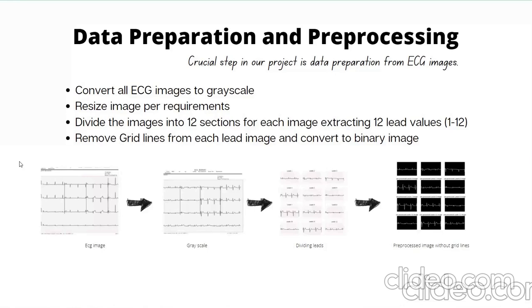So we just kept the foreground and the background distinction using thresholding. Once we have the threshold value and the thresholding is done, we get a binary image out of it. And once we had the binary image, we have an image in place.